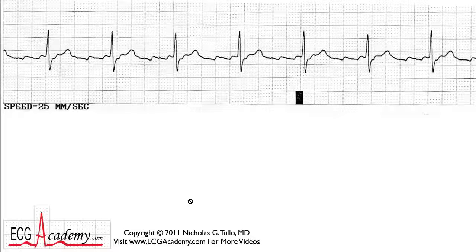Remember, Chalk Talks assume you know the basics. What I'm trying to do is get you used to reading more difficult tracings.